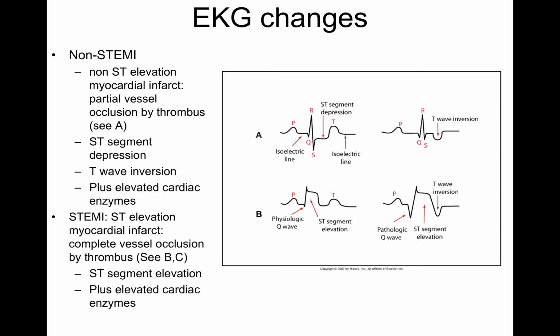So what we see with the differences, I just talked about these. What we're looking for in any sort of heart attack is ST changes. How the morphology goes, think to yourself like the floors of a house. You have your basement. So I have a 2-story house with a basement. If I start at the very low level, ST depression is going to be my injury.